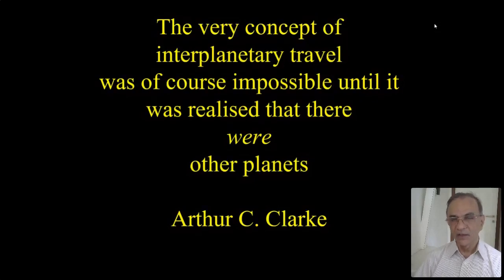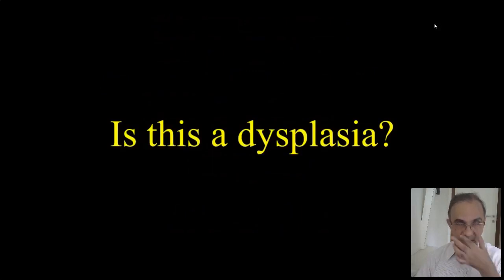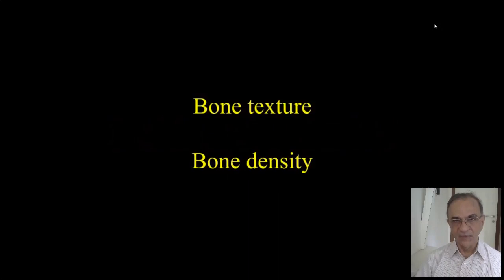If you are a little more experienced looking at the patient, you can say that this is a skeletal dysplasia. So that comes from habit of looking at normals. So when you want to look at skeletal dysplasia, by and large, looking at the bone, you will be able to say that this is some form of skeletal dysplasia. This requires no teaching. This requires just a little bit of temporal lobe memory of seeing normal bones day after day. So this is the first question. Is this a skeletal dysplasia?